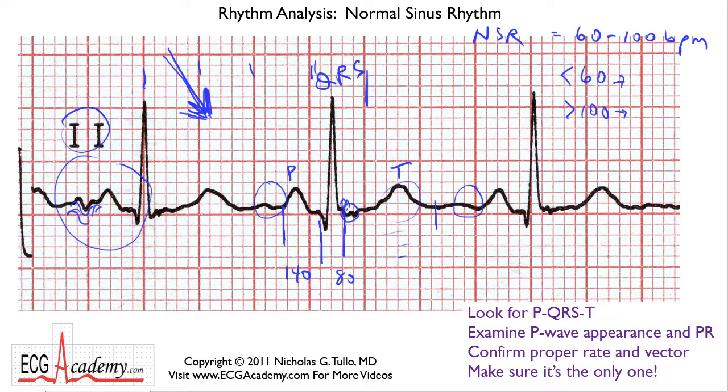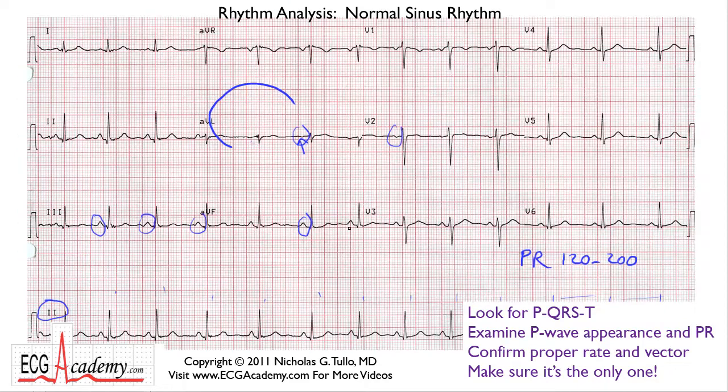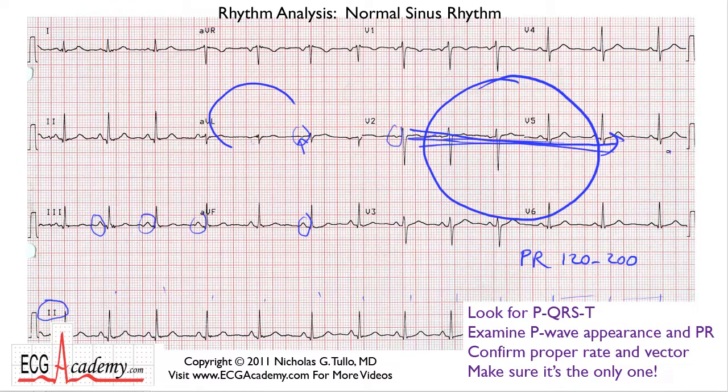If you go back to that original ECG, a lot of people will tell you, well, if you look at that circle of axis and you look at if this is lead 1 and this is lead AVF, anywhere in this quadrant should be where the normal P wave winds up. And so it should be positive in lead 1 because it's heading towards lead 1, and it should be positive in AVF.